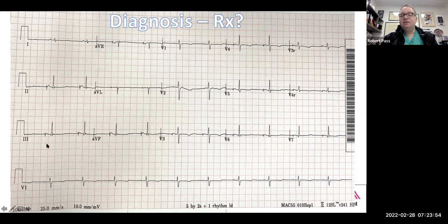Also, in this particular electrocardiogram machine, all the leads are simultaneous. That is not true, by the way, in all machines. Usually the 12 lead displayed up here is all simultaneous, but in some machines, the rhythm strip on the bottom may not be simultaneous with what's going on above it. You always want to check your particular machine. In our case, the rhythm strip is always simultaneous with the tracing above.